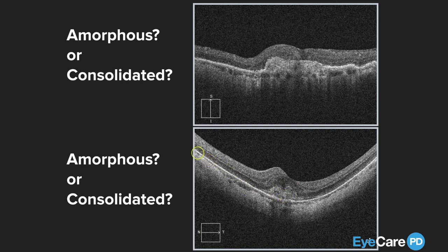And what do you think of this patient? Look at that staphyloma. Wow, super thin choroid. That is another example for you of myopic choroidal neovascularization with the presence of amorphous subretinal hyperreflective material as an early sign of CNV. In fact, in myopes, it's one of the earliest things that you're going to see: subretinal hyperreflective material without very much intraretinal fluid or subretinal fluid.